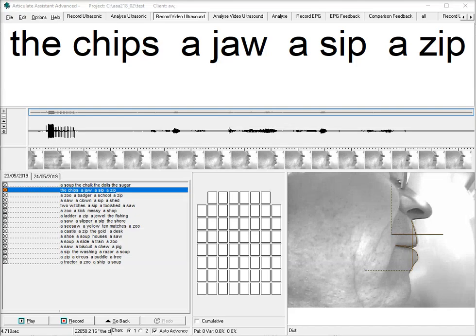In this video we'll talk about scaling to real-world coordinates. It's not absolutely necessary to do this, but for your data to make sense you probably want all of the splines in the image to have an appropriate real-world scale.